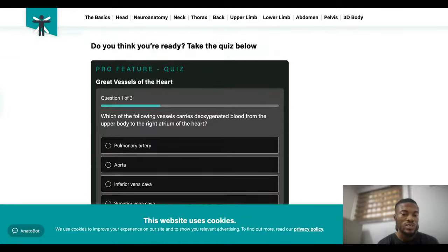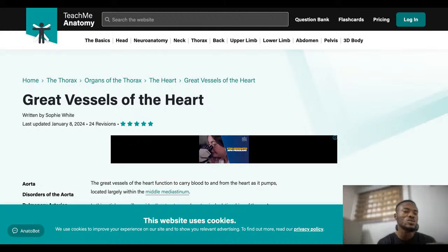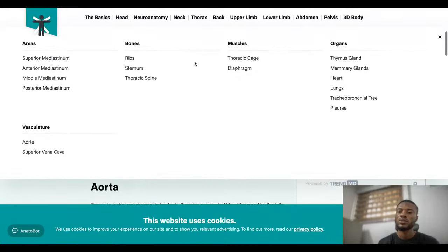All these are appreciable on the chest X-ray if you learn it very well. I may not teach you everything. I cannot teach you everything. But with practice, you will be able to see things that somebody will not see. You will be able to locate the positions of even the ventricles and the atria and all that.